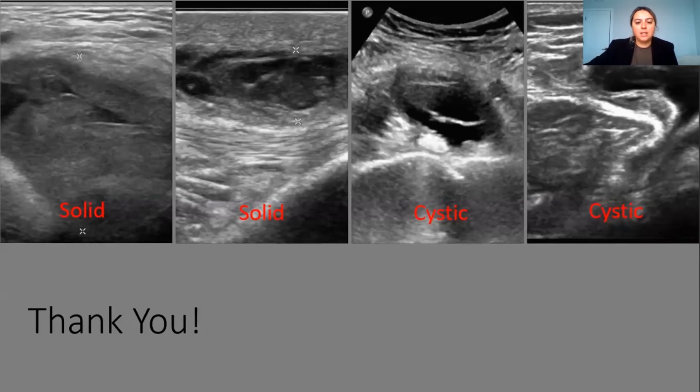So the first question is, any experience with scapulothoracic interval bursitis? So, you know, what's really good about ultrasound is its ability to see these superficial structures. When you get to the deeper anatomic areas, especially those that are close to several different osseous structures, the ribs, the scapula, for example, it is challenging to see the inflamed bursa for sure.